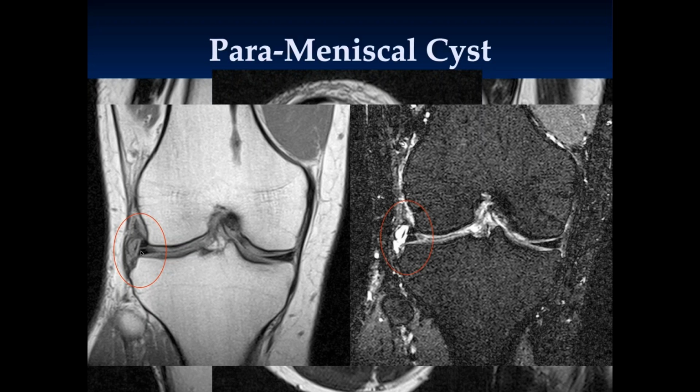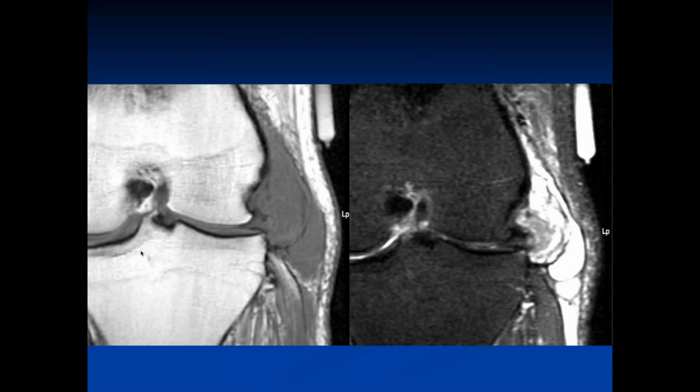We haven't mentioned most of these cysts are lateral, and that's probably because the meniscus is kind of more lax than the medial one. Okay. I really don't know the reason, but I would guess that. Yeah, I think that's probably a good guess, John. And here we can see, because the cysts are more common laterally, but the tears are more common medially. So interesting.